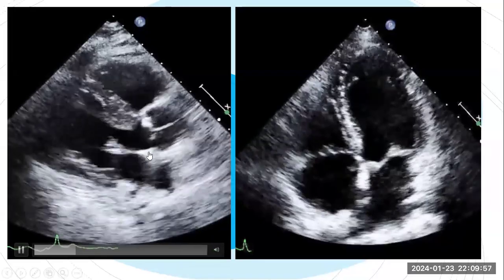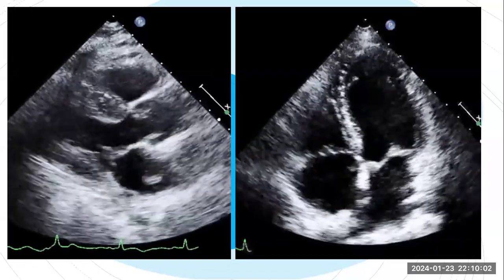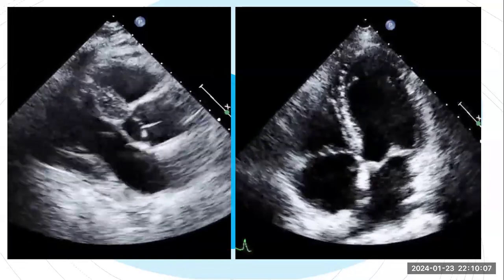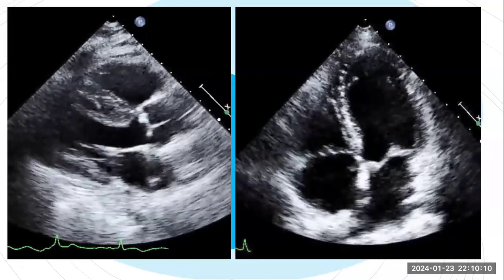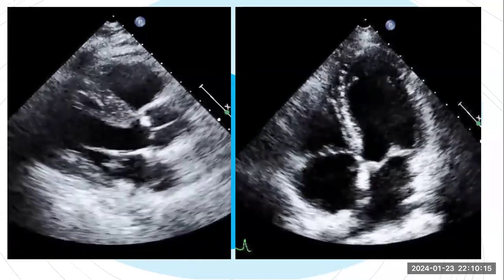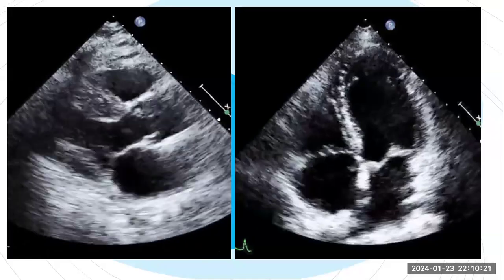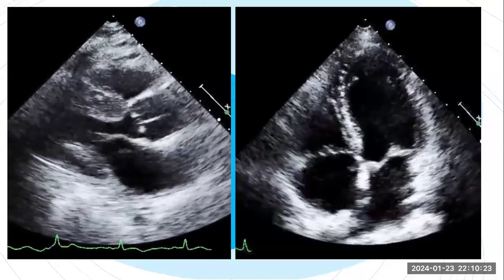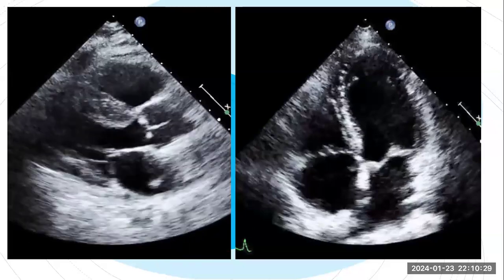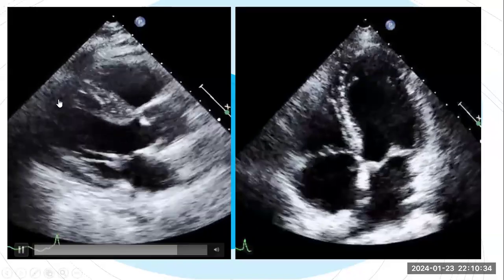I need somebody to comment on this first before going to the other review or the other video. What do you think, guys? What's the abnormality here? This is one of the codes in your sheet. So what's the abnormal thing that you see? We will discuss together, no worries. Tell me, what do you see here? I will give you a clue.